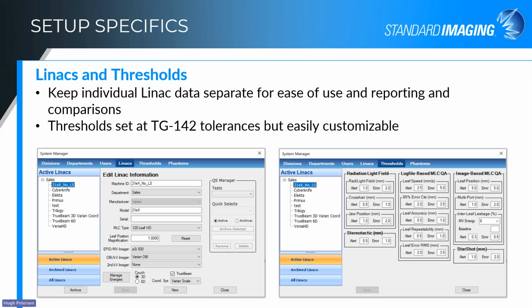And on the thresholds page on the right, everything is set up as a default for TG142 recommendations, but those can be tightened or loosened as you see fit, very easily within the system manager.